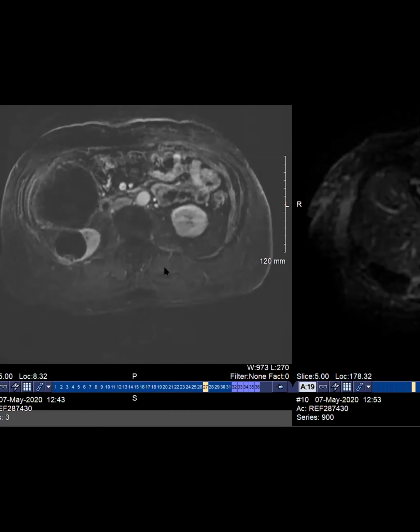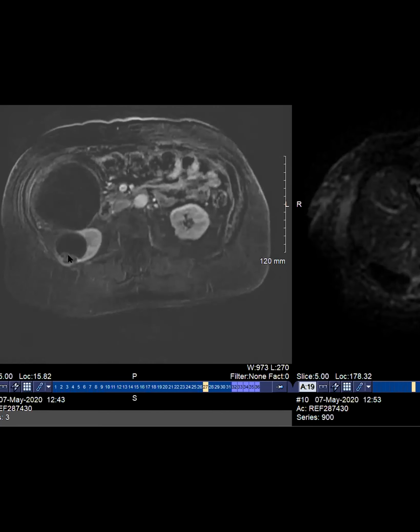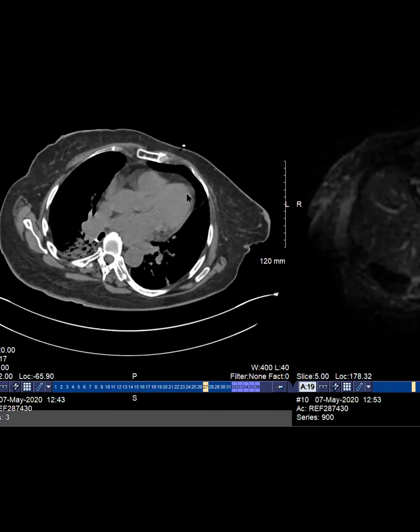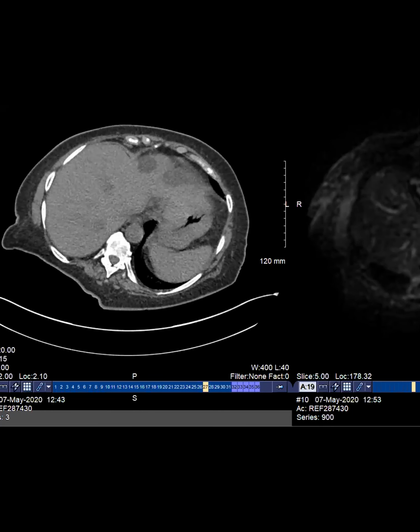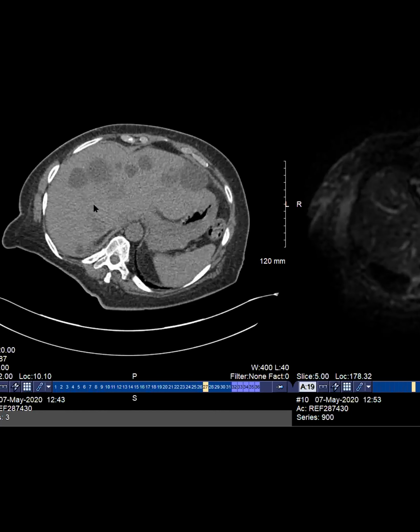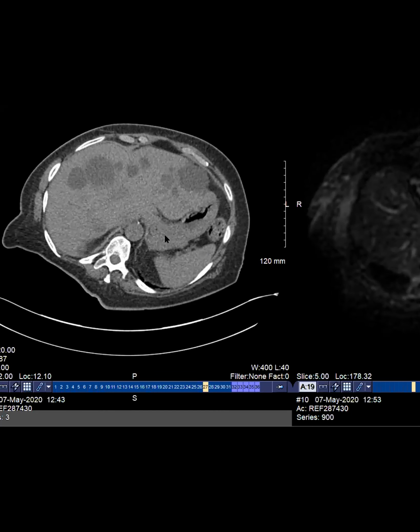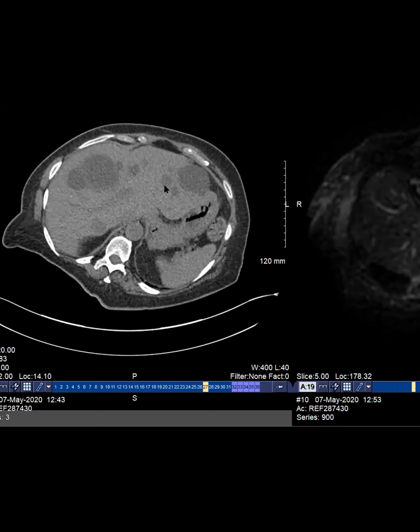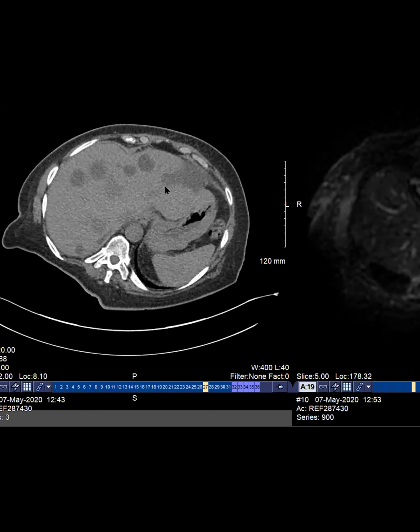And then just the renal lesion that took up FDG, was FDG avid, also is a complex cyst with internal septations. I do not remember the discussion, this is an older case, but we happened to biopsy this lesion. We did a CT guided biopsy, and this came back as, any guesses? This came back as a cholangiocarcinoma.